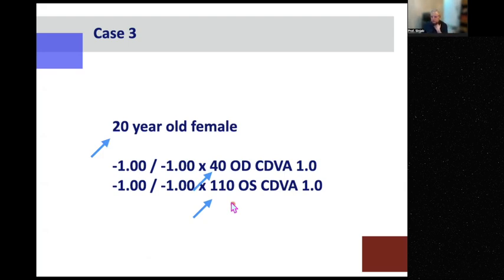What is the flat axis of the right eye? Write a number, please. 40.